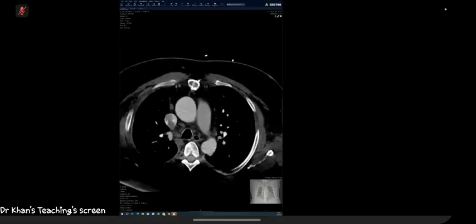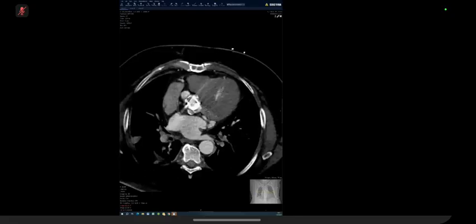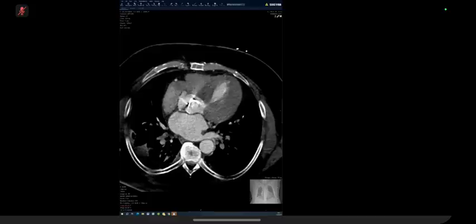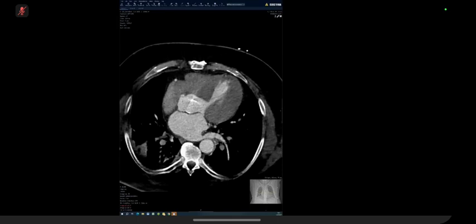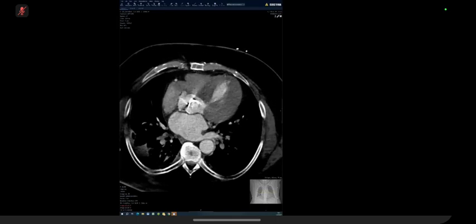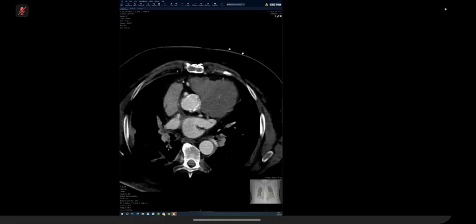So you would describe that, if you see that, if you pick that, you would say the patient has an aortic valve replacement. There is an irregular appearance to the contour of the aortic sinus. I am suspicious for outpouching. Given the patient's previous history, this may represent, and I want you to think out loud, this may represent normal post-operative appearance. I would be interested in looking at the patient's previous history.